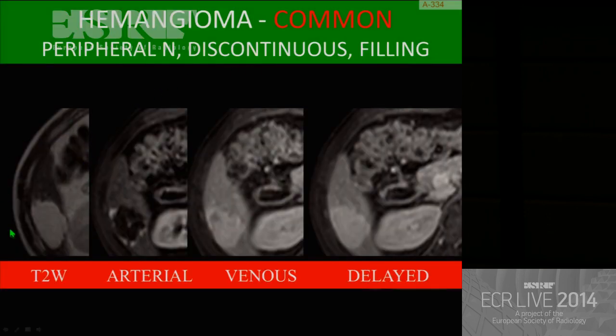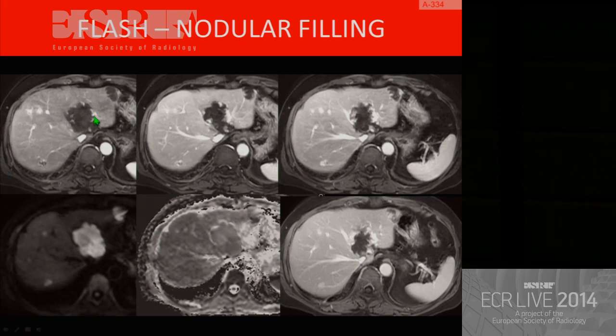Can we have an additional value from MR imaging? Yes. In addition to the vascular diagnostic information, it is very bright on T2 weighted images. So this can help us in difficult cases. How about this patient? This is typical hemangioma, peripheral nodular enhancement, and you can see flash-filling hemangioma. So flash-filling hemangiomas are different than the cavernous hemangioma. You can see diffuse enhancement, and they keep the contrast on the venous phase. So this is also fairly typical for these kinds of hemangiomas.